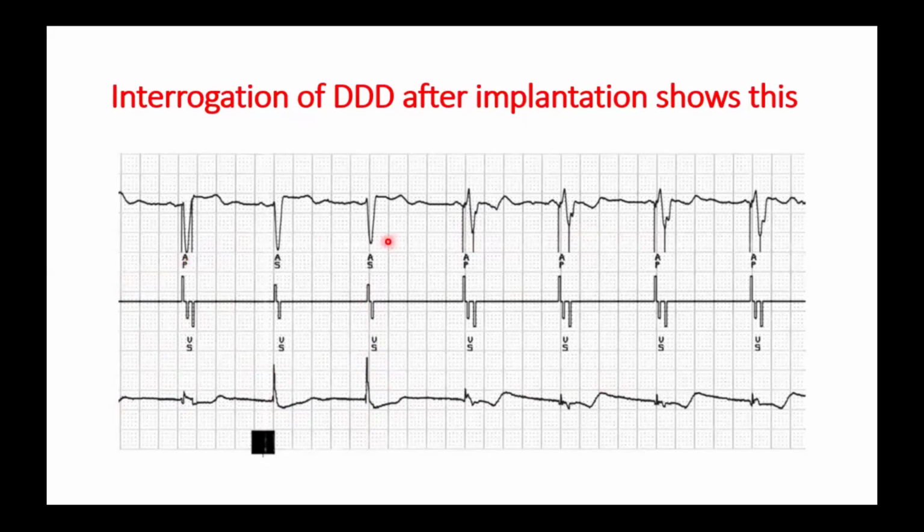Dr. Iman, you were answering very well. Dr. Didier, Dr. Amr Gamal. It looks like the atrial lead is oversensing the ventricular, or the atrial lead dislodged and became in the ventricle, so it's sensing the ventricular. Excellent, excellent.